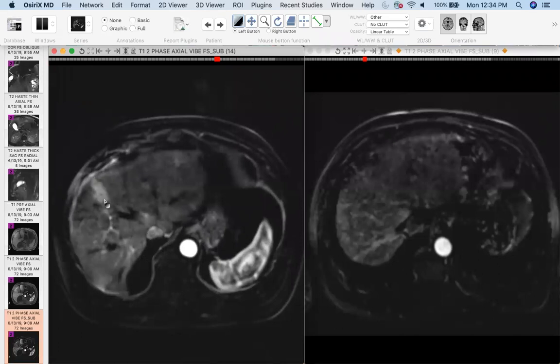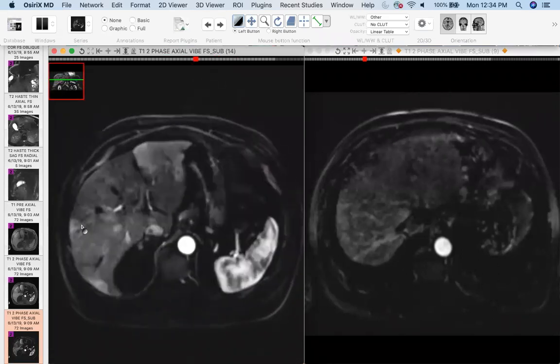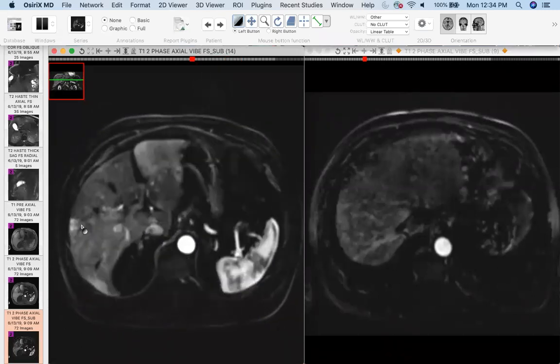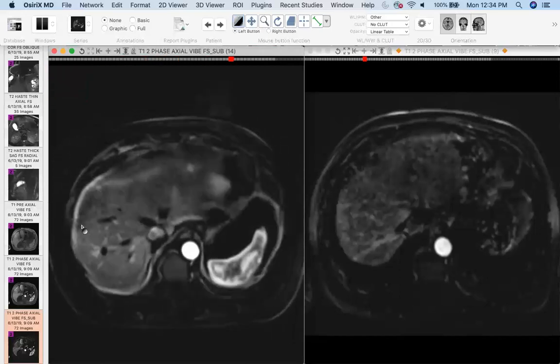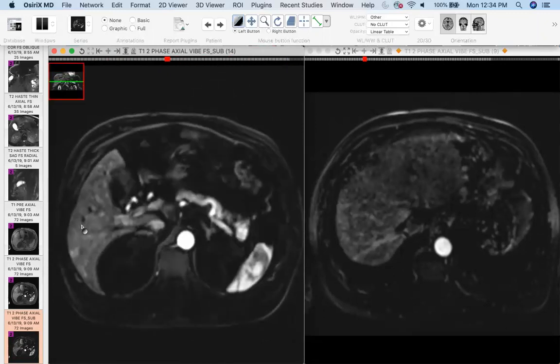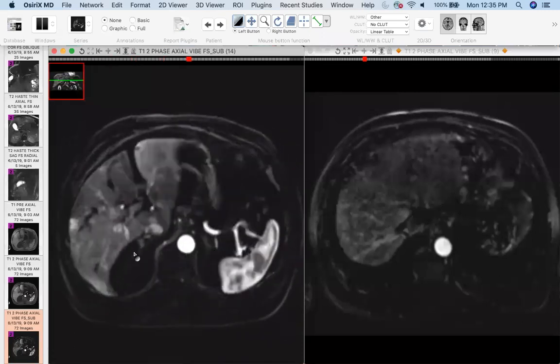What was called was all these arterially enhancing scattered foci. What do you think? This was given as a wide differential diagnosis, including metastasis. And this is why my hepatology colleague was reaching out to me. And this is exactly what I told them.